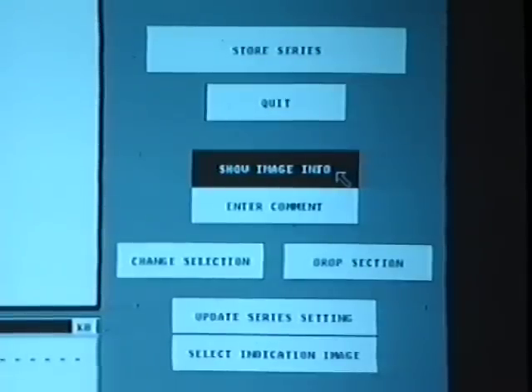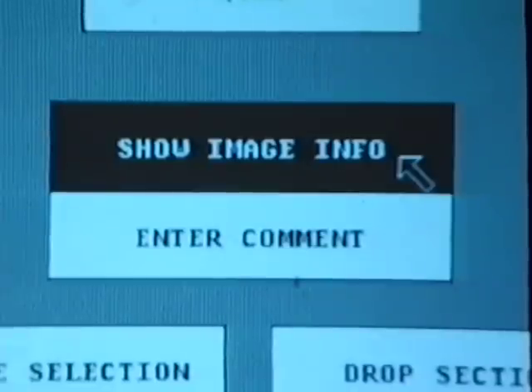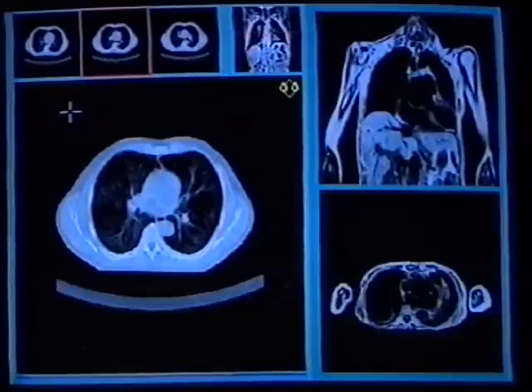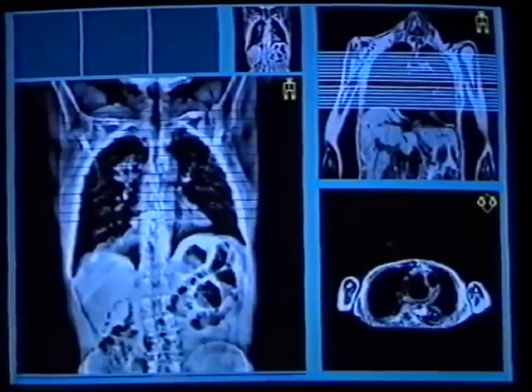TMS is operated by using menus activated by pointing and clicking on the text monitor. The images stored in the database for each patient can at any time during the operation of TMS be displayed as an index image holding image icons, so-called IMICs. Necessary images to be visualized for reference studies are selected by pointing and clicking in the corresponding IMICs.